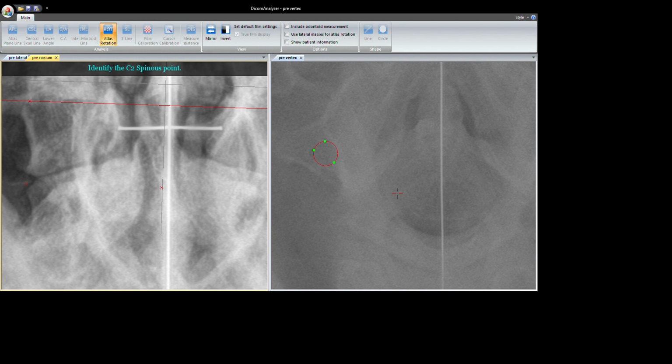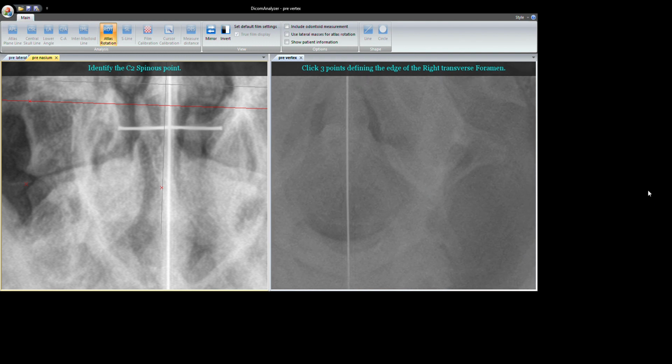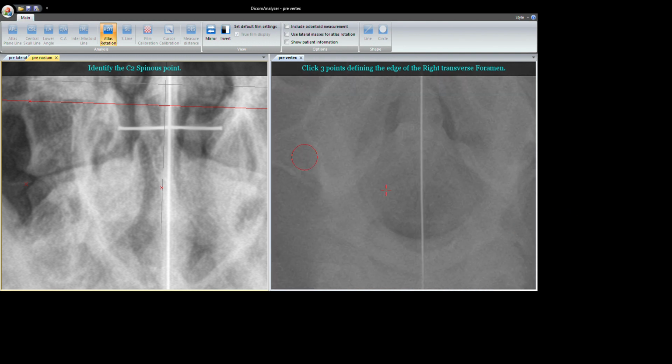If at any point you don't like a point you've picked, you'll use the backspace and it will unselect that point and allow you to repick it. And you can do that until you've completed a circle. Once you've done that, or completed any function where it's drawn the line, your only option is to close it and redo it. So let's say I didn't like that circle.